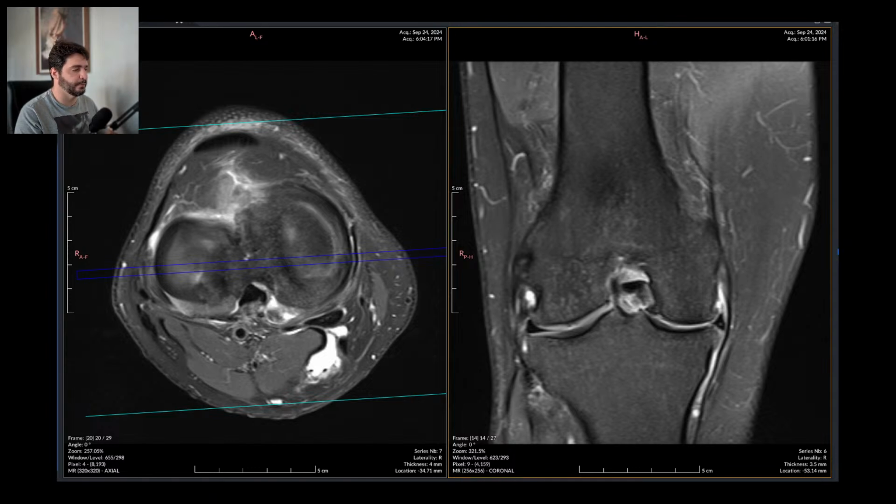And he was supposed to get a knee replacement for the other side, and he just won't go to surgery. He doesn't want to. Oh, 2003? I mean, 20 years is more than enough to make a bad knee for replacement surgery. I wonder how bad it is today on an MRI.